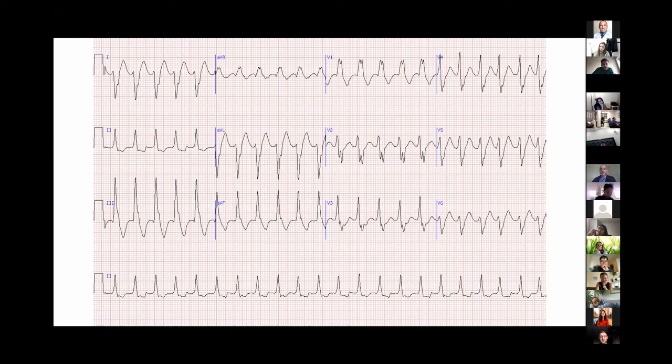It's very tough to resist jumping to something like this, right? But I have picked the EKGs that are going to be straightforward. But if you jump to a conclusion like this, you might make a mistake, because there are instances where you will be fooled. So that's why you should always go systematically.